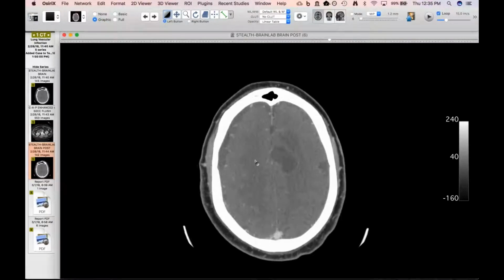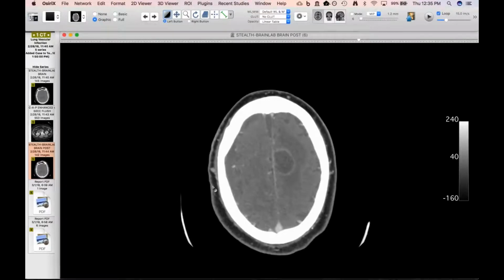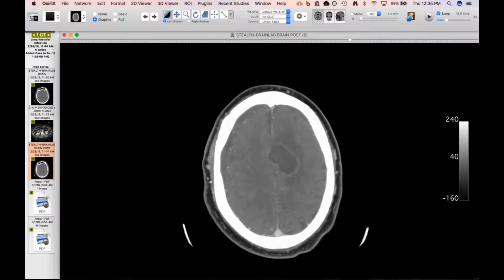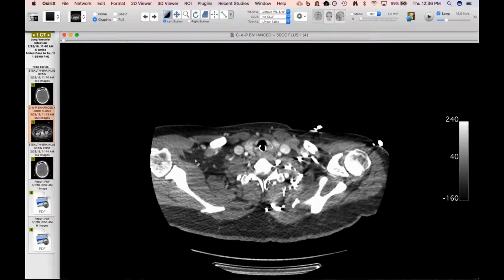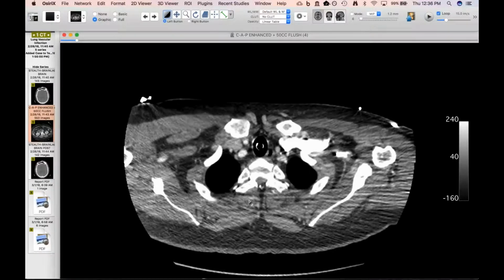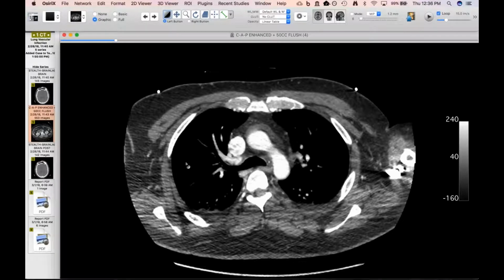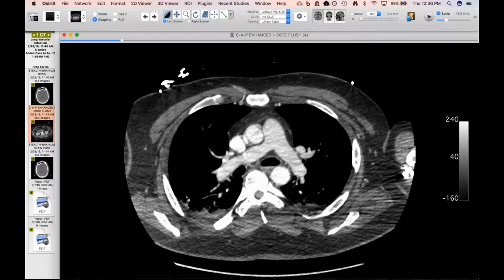As happens at our place and probably all of yours, whenever there's something like this it was said to be likely a mass. So he was sent here for evaluation for suspected either primary mass or metastatic disease. And so he got the routine chest, abdomen, and pelvis to look for either primary or metastatic disease. In the meantime, our neuroradiologists were re-reviewing the outside MR and thought it looked more like an abscess, and a subdural empyema on the right.